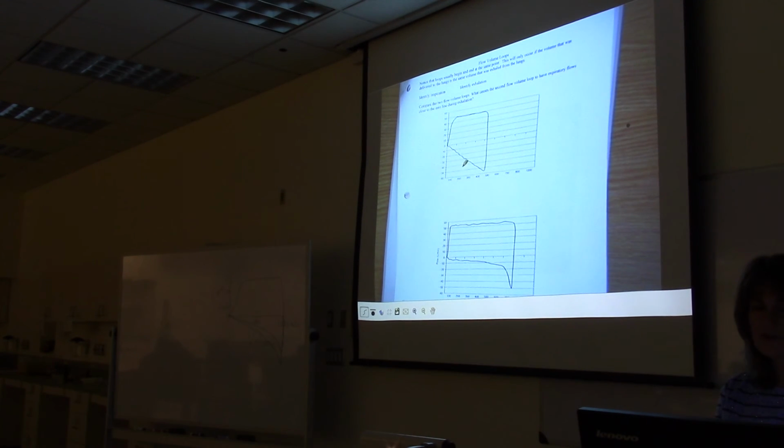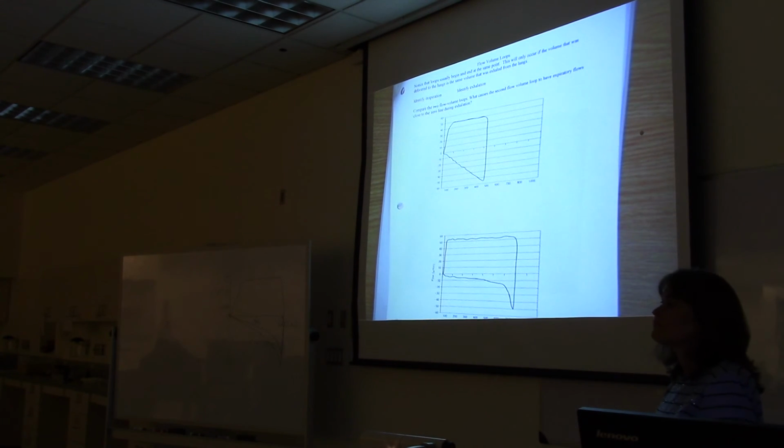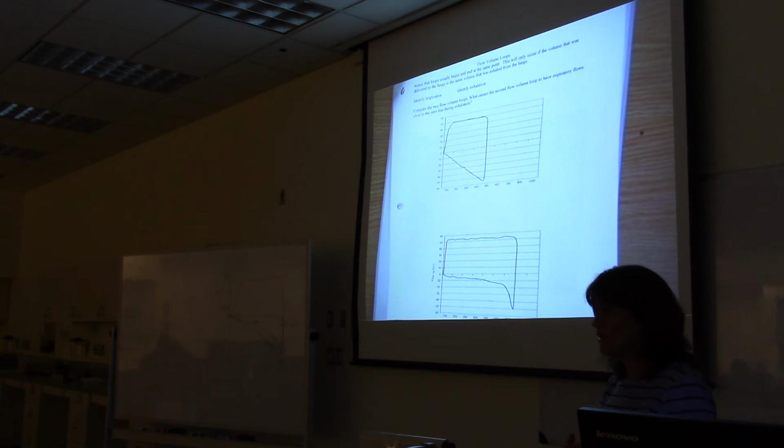Looks like 50 liters a minute on exhalation. But here, it's saying 50 liters a minute initially, but then that really slows down and the flows are very, very small until all the air is back out of the lungs. Very compact. Yeah, these are obstructed airways.